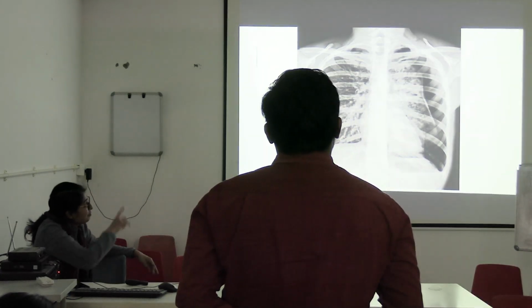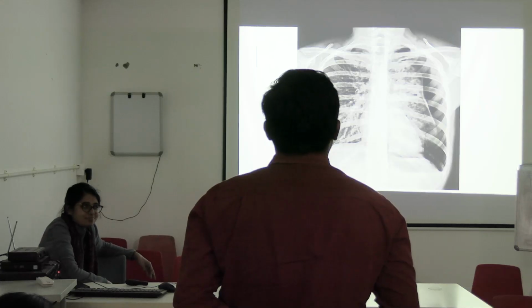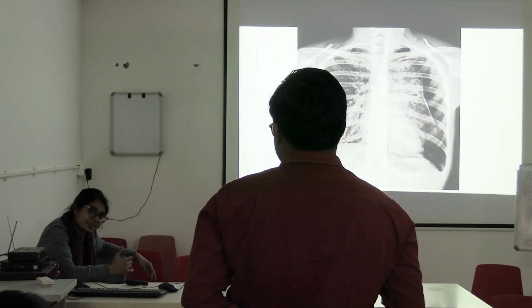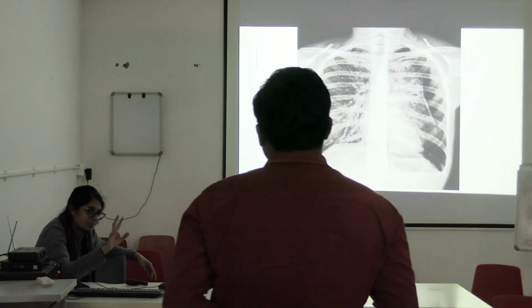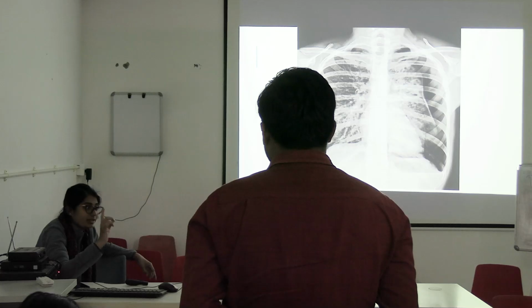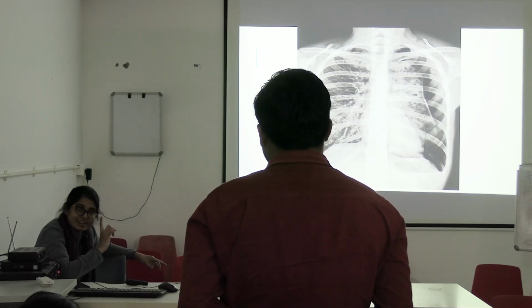So you'll have to see the medial ends of the clavicle. Look at them. Is it central position or is it rotated? Central position. Okay, তাহলে দুটো পয়েন্ট হয়ে গেল। এইভাবে কিন্তু সাজিয়ে বলতে হবে। First, it is a sciagram of the chest with PA view with central position.